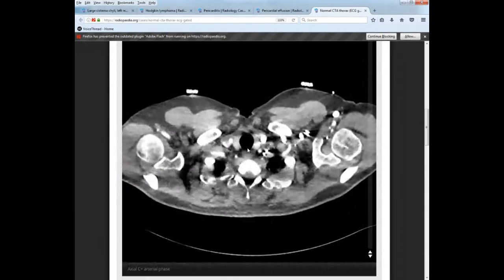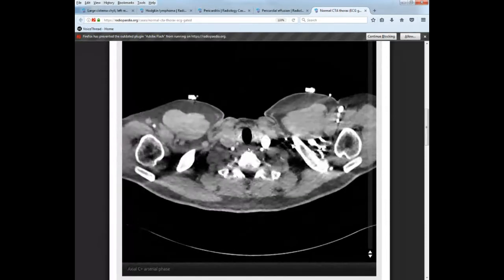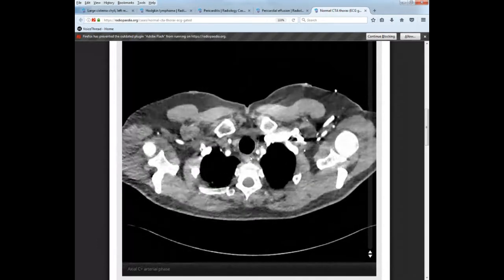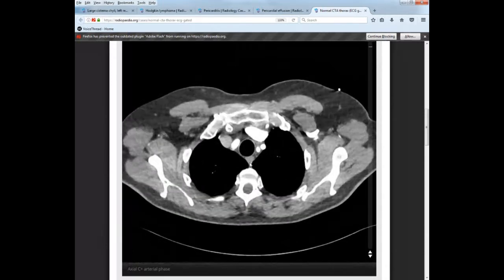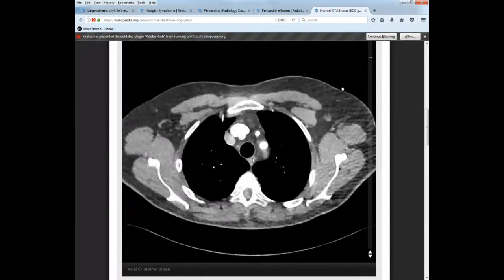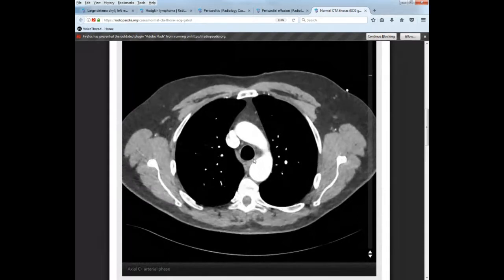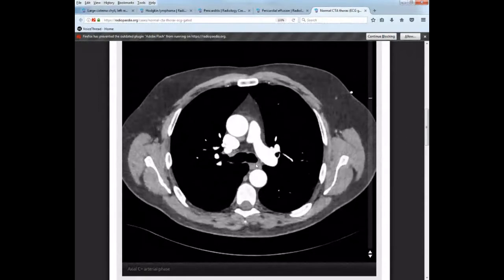That's your collapsed esophagus, okay? So as we go up, just posterior to the trachea is the esophagus right here. It's a tube, it's collapsed on itself, and if there's nothing in it, it just looks like this dense area. But you can see in some areas, oh, there's a little bit of air, okay? So it's going to have teeny pockets of air, and it's going to start to shift to the patient's left as we enter the chest cavity, travel through the thoracic cavity into the abdominal cavity. It's going to take a turn to the left.